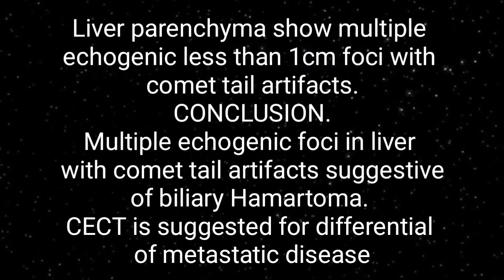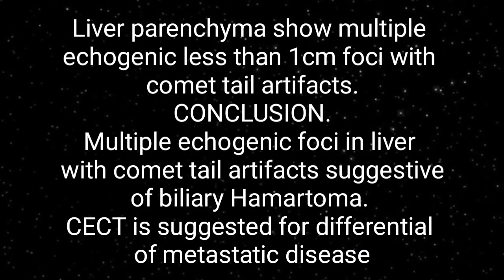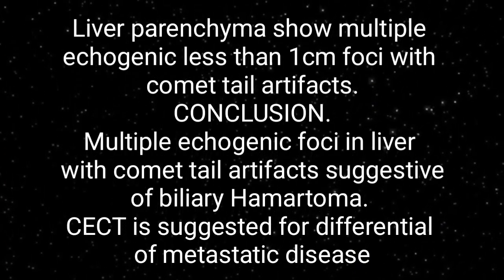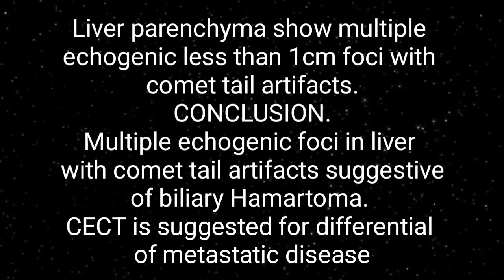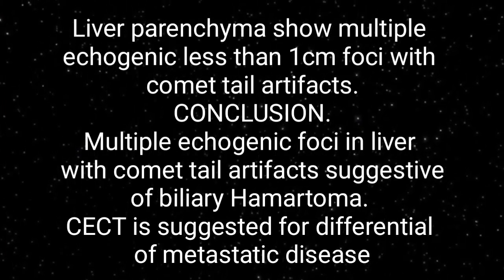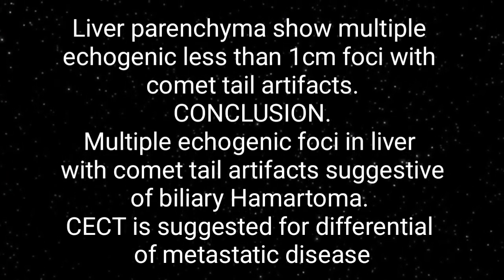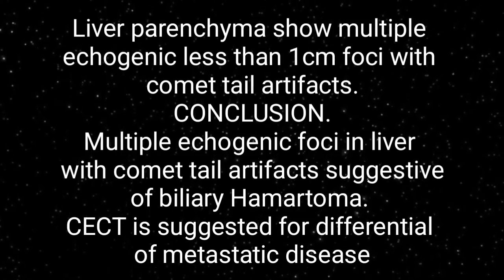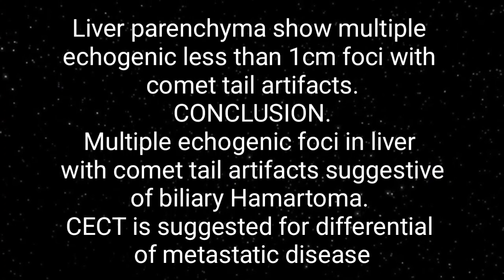It's also worth mentioning here that sometimes calcification of the liver may also be confused with biliary hamartoma. The difference between liver calcification and biliary hamartoma is that the calcification of the liver will not have dirty shadowing and will not have a comet tail artifact, while in biliary hamartoma you will see comet tail artifacts, which are easily distinguishable from hepatic calcification.